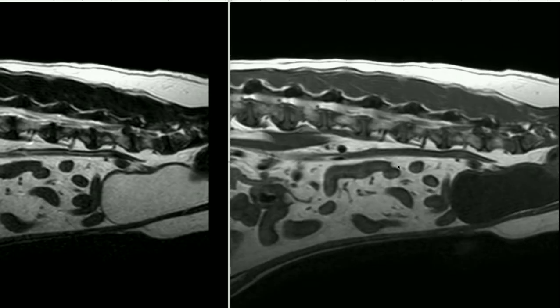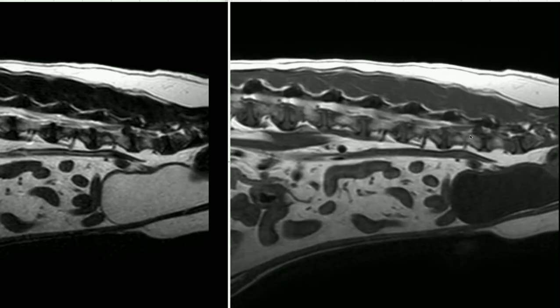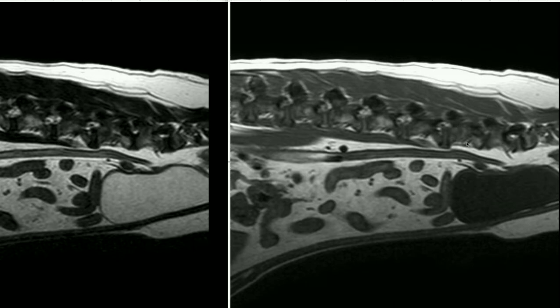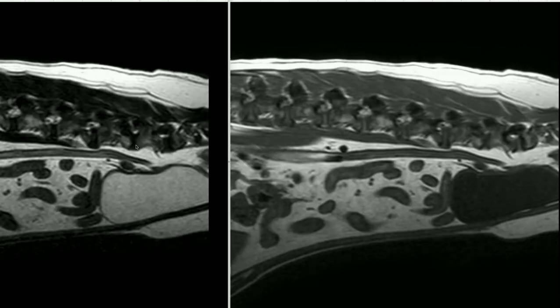However, as we go off to the parasagittal images, we can see on the right-hand side that we have this abnormal intervertebral foramina at L6-7. The sagittal T1 weighted images are a really nice sequence for assessment of the lumbosacral intervertebral foramina, because we can see very nicely attenuation of periradicular fat when we have foraminal stenosis. In this particular study, we can see that there appears to be a small nodule of low signal on both sequences, tissue which is extending or adjacent to the L6-7 intervertebral disc and appearing to extend into the right-sided intervertebral foramina.